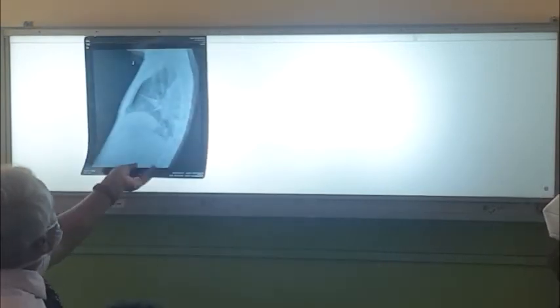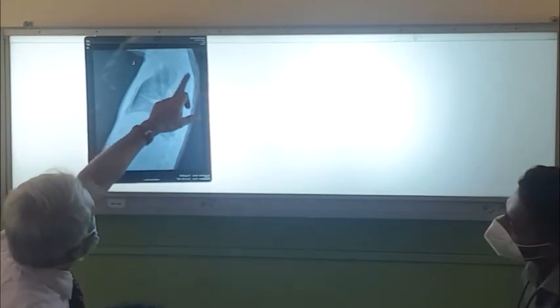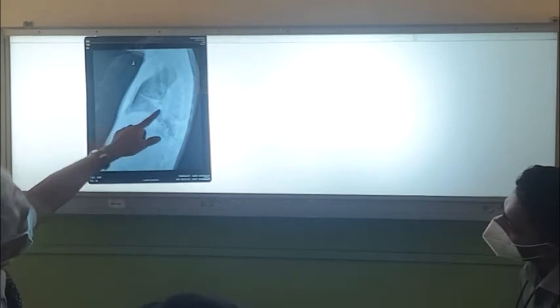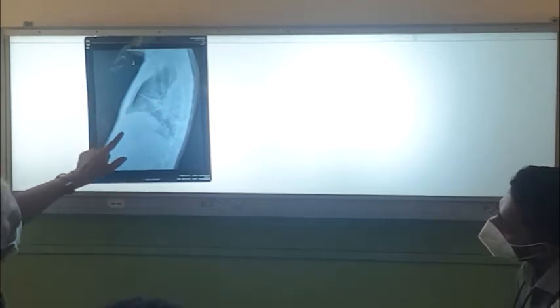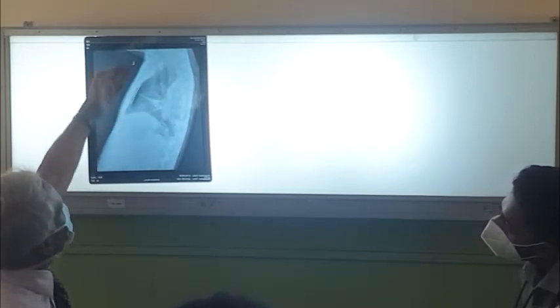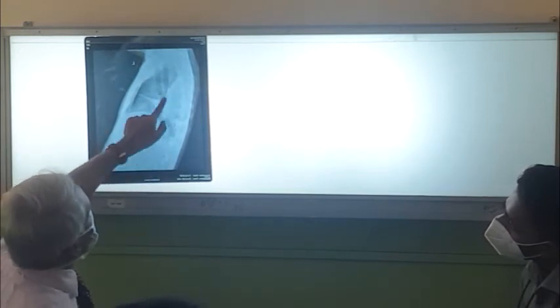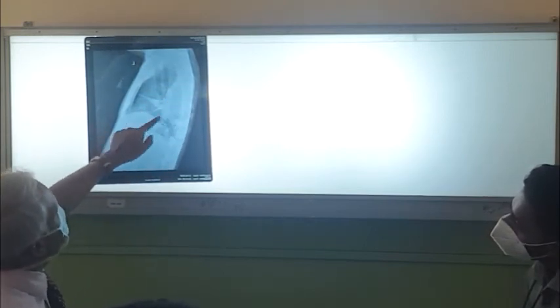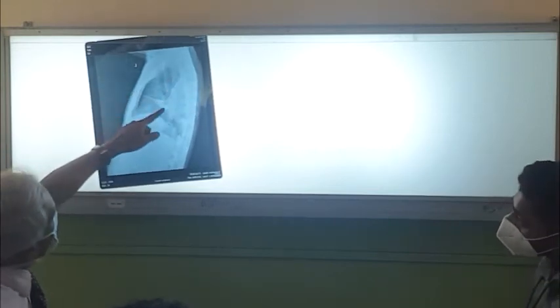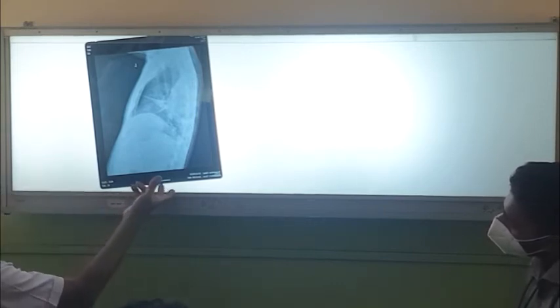This is just to show you encysted fluid, with transverse fissure fluid, oblique fissure fluid. So this should be the right side. The right side has the encysted fluid, although they have done a left as well. So right is this, right? So it's the right sided encysted fluid here with fluid in the oblique, and you can nicely see the fluid in the fissure. So that's why I'm keeping it here, and this may be some tablets.